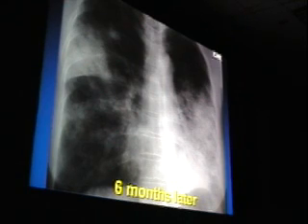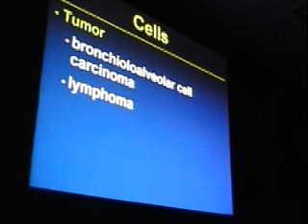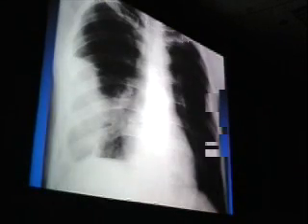And the first thing there will be neoplasms. And the neoplasms, so we'll do this primarily in bronchioloalveolar cell carcinoma. We say that on the boards, even though it's less likely. This patient turned out to have the multifocal, so-called pneumonic form of bronchoalveolar cell carcinoma.